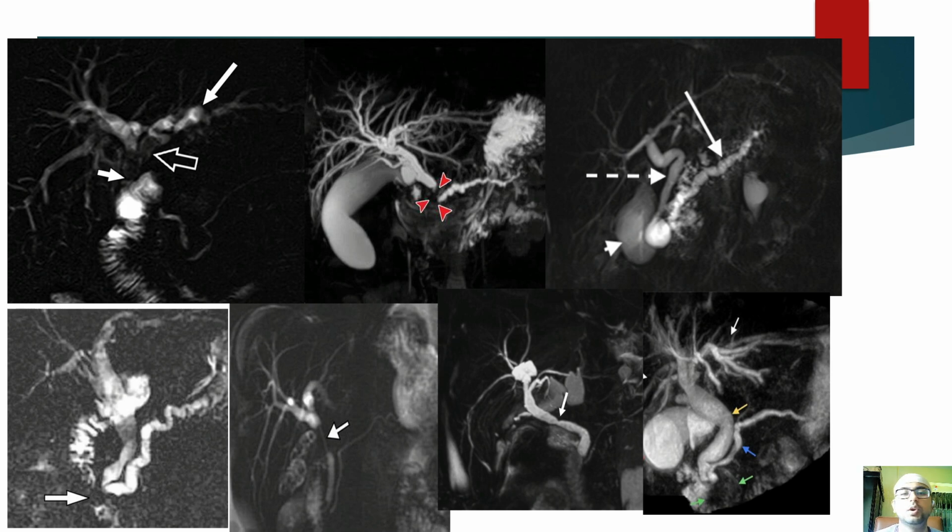And now this is your quiz. What is the film? I think you know, this is more like MRI or 3D, system specific imaging, right? This is an MRCP, magnetic resonance cholangiopancreatogram. So this is called the MRCP.